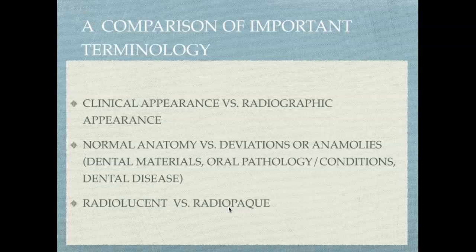So there's some resistance to the passage of the x-rays through those types of structures or materials, and therefore the image looks lighter in color, lighter in contrast on the radiograph.